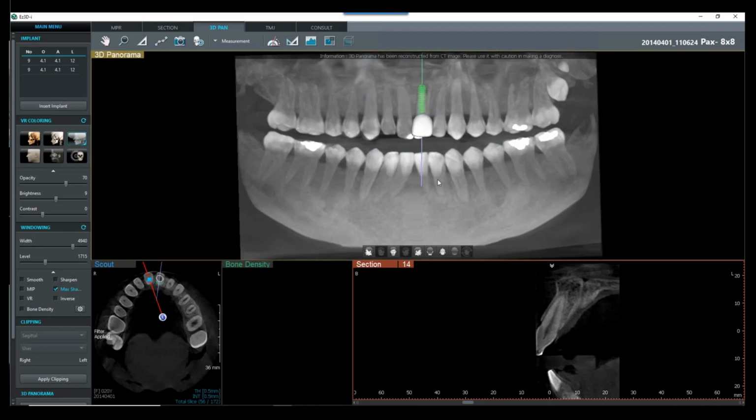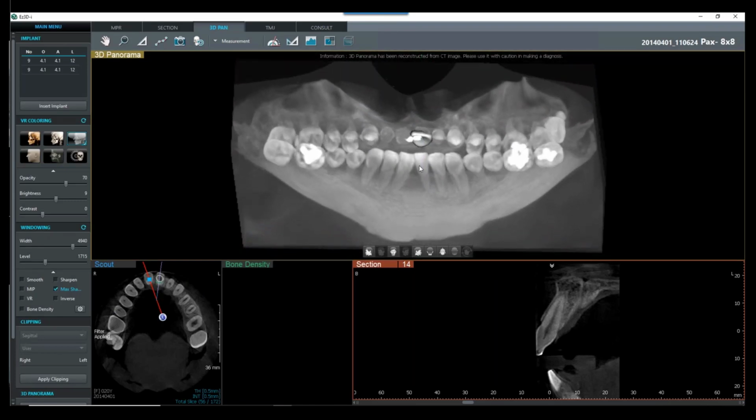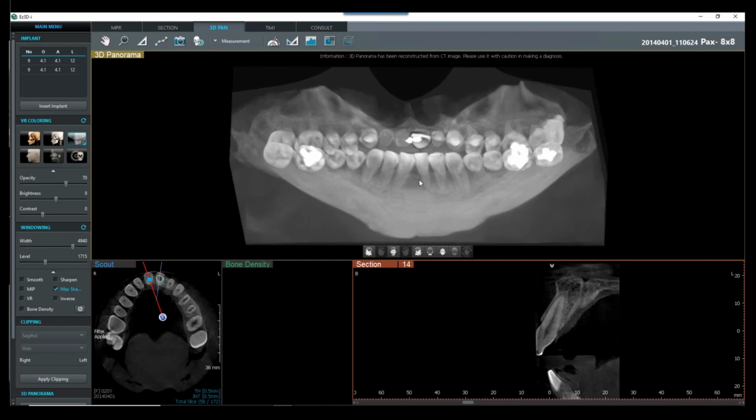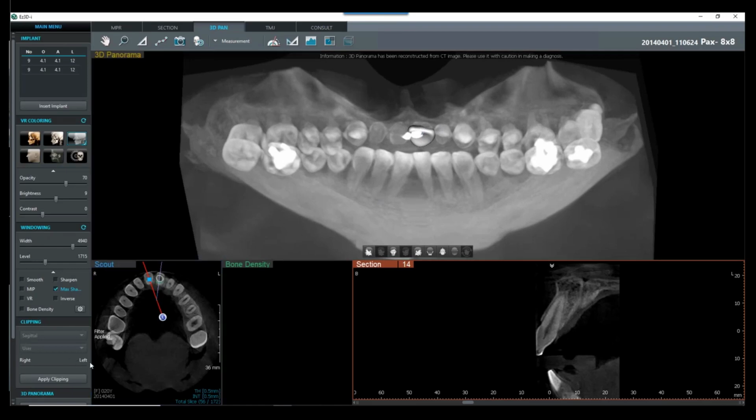Yeah, let's take a look at the crown. Looking at that crown there, I want to flip it up and get an occlusal surface view because I want to customize that crown, just to demonstrate that. If we flip that up, in that occlusal view, we have this nice feature in our software called clipping. It's easier to position it where you want to move it first. Click on apply clipping, and you can see in the lower left-hand corner there, we can choose the direction, whether you want to cut it sagittally, axially, just pick your direction. We're going to use axial.